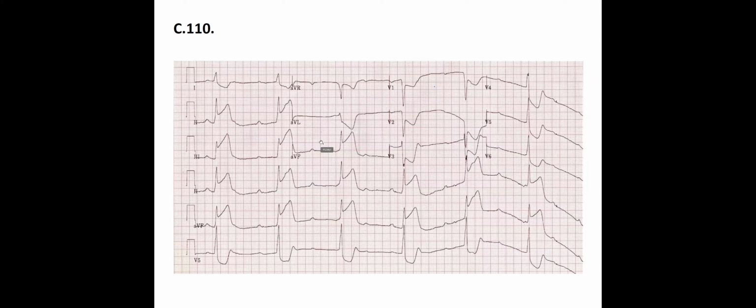So it looks like there is no connection between P and QRS. It's rhythmic again. Here we see the PP interval. And after you should shift it and you will see that some P is inside the QRS complex. And this is rhythmic, so it's not a high degree because that would make it arrhythmic. This is why you said it's a third degree AV block. And again, that's a junctional escape rhythm, a low junctional escape rhythm, because we will learn later on that ischemic changes, ST elevation, and so on, can only be seen when we have a supraventricular impulse formation. Okay, good.